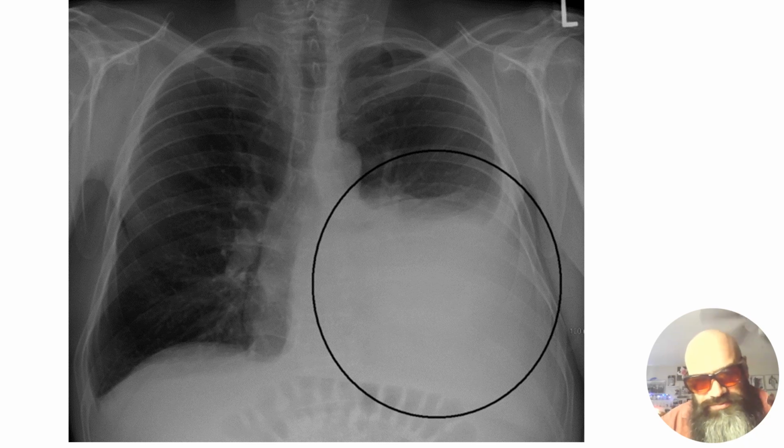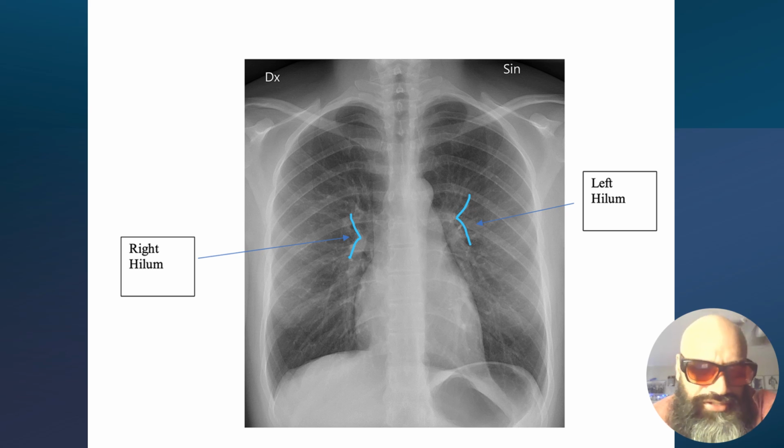We still have some remnants of air in the lung in the left upper lobe, but this is a clear-cut example of a liquid or water density that is demonstrated as a space-occupying lesion and completely obliterating all the cardiac borders, hemidiaphragm borders, and costophrenic angles, which is consistent with some sort of fluid hemodynamic insult to the lungs and chest cavity.